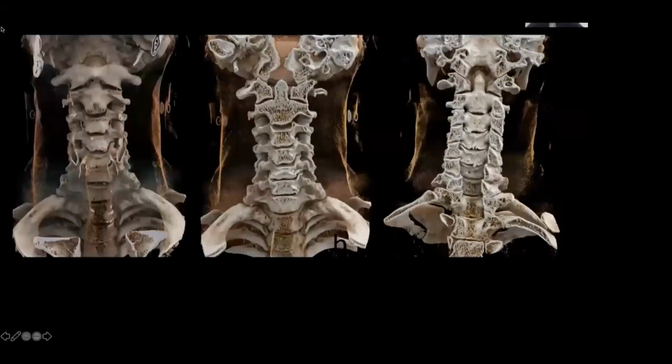Here, I wanted to just point out a few aspects of the cervical spine anatomy. So people talk about some critical features of the cervical spine. So, as you know, you have the atlas carrying the world on his shoulders. Also, in biomechanics, they talk about the atlas as the cradle.